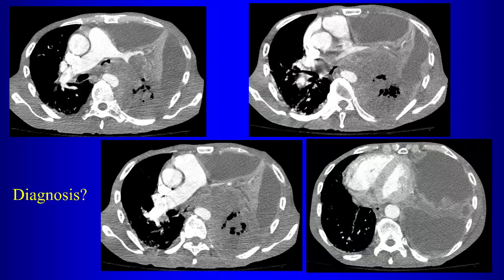Nodularity of the pleural surface, as opposed to smooth pleural thickening. Smooth pleural thickening is associated with empyema. Nodularity of the pleural surface is associated with metastatic disease and malignancy. What do we think here? Smooth or nodular? Where?